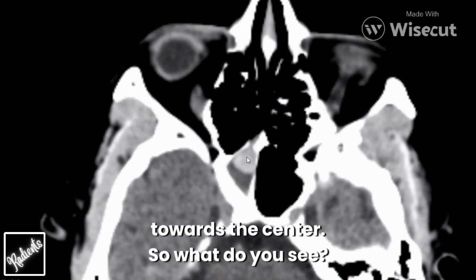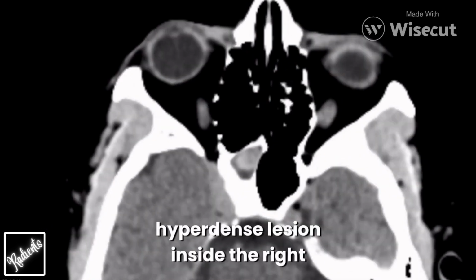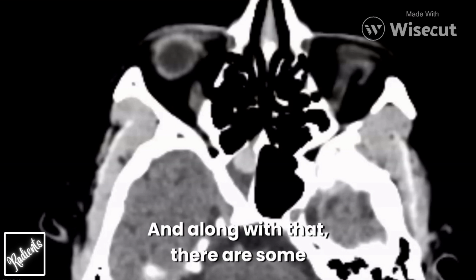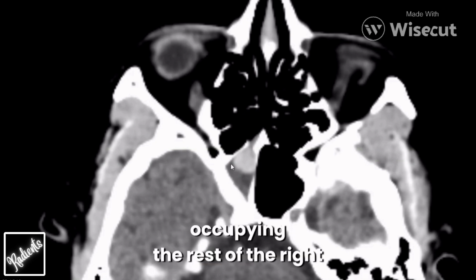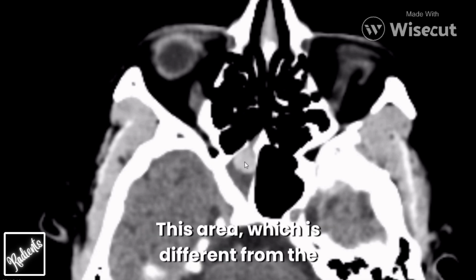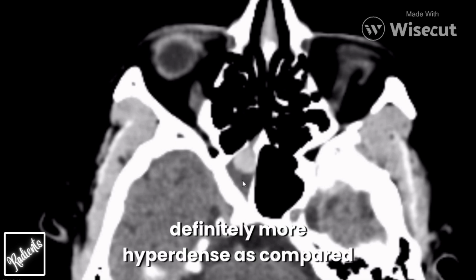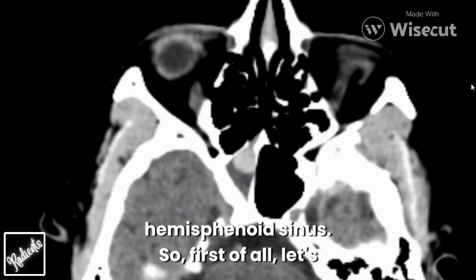So what do you see? We can see that there is a well-defined hyperdense lesion inside the right hemisphenoid sinus, right? And along with that, there are some hypodense areas as well, which is occupying the rest of the right hemisphenoid sinus, right? So it's definitely more hyperdense. This area which is different from the hyperdense lesion, this area is also definitely more hyperdense as compared to the air on the contralateral hemisphenoid sinus.